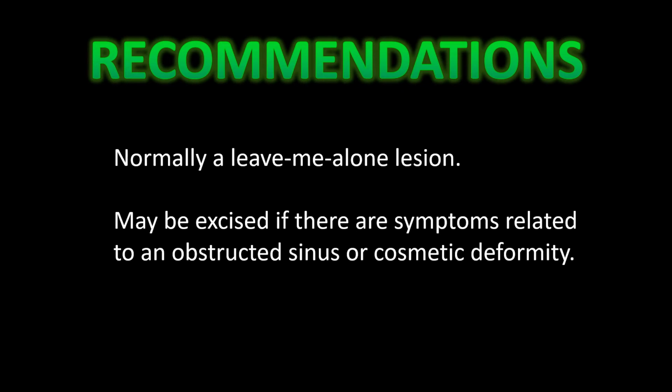So normally there will not be any further recommendations or imaging on a patient with an osteoma. It's a leave me alone lesion, meaning no big deal. However, there may be an excision performed if there are direct symptoms related to the presence of that osteoma, like an obstructed sinus or a large cosmetic deformity.